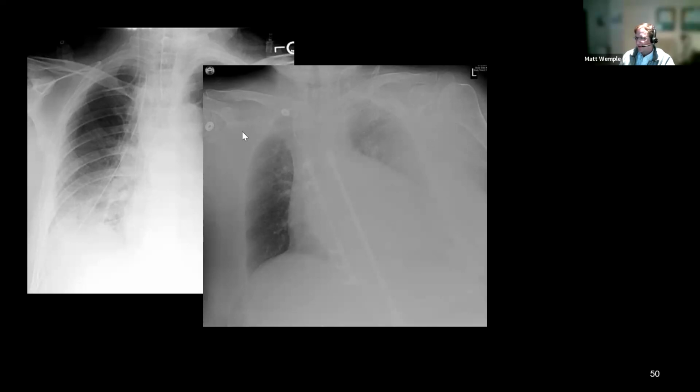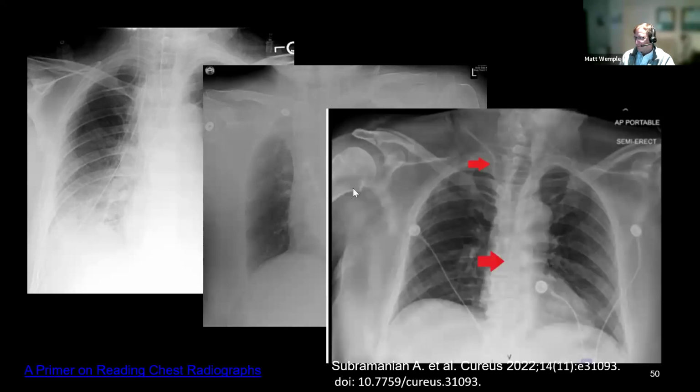That's also not great. This one actually travels into a vessel, and then it turns earlier and then goes down. This is actually in the aorta. So this is definitely one you want to call vascular surgery about because that's in an artery and not a vein.